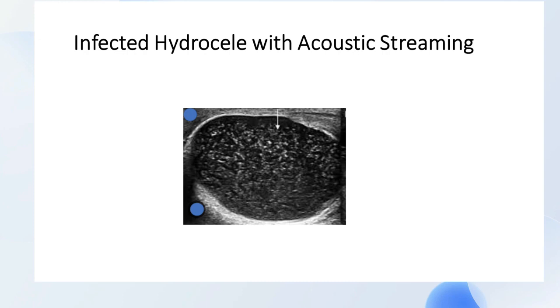So after infection, when an abscess ruptures or when pus collects, it can give us this type of configuration.